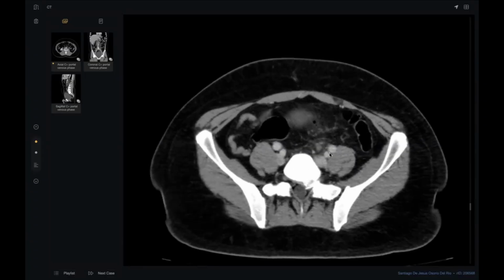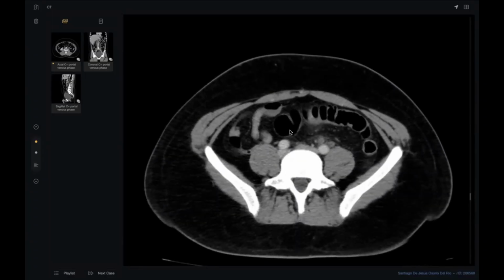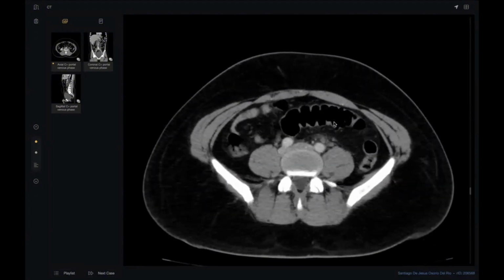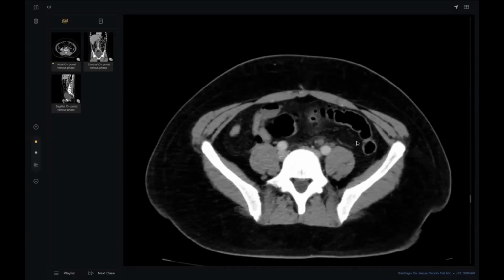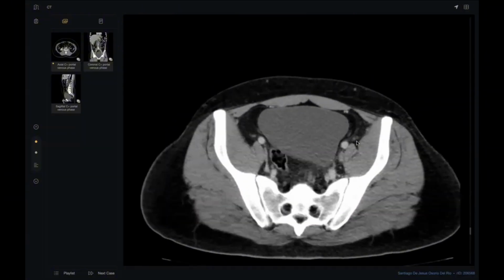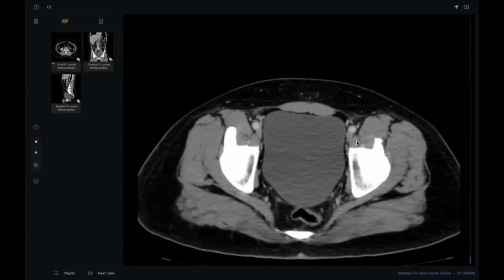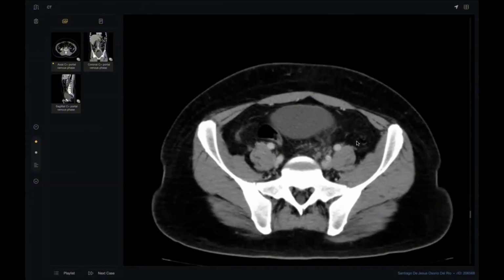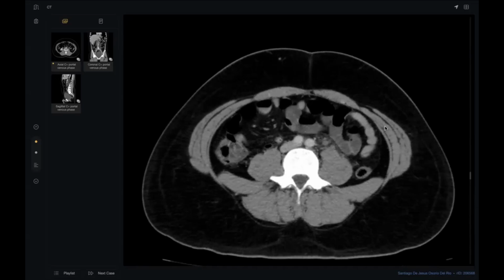And another point. Where is the diverticulitis? Where? What is this? Diverticulitis. Yes, where? Sir, which part? This is the transverse colon, I guess. No, we are very low down. Okay, sir. So I will go down. This is the descending colon. This is the sigmoid colon.